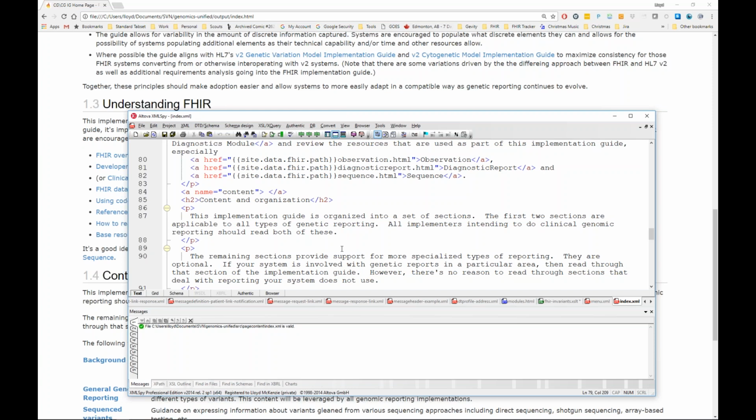It's also possible to have pages coded using Markdown. The CG.ig is not currently configured to do that because I don't like things that I can't validate, and I can't validate Markdown. But that is an option for workgroups that perhaps prefer to use Markdown markup instead of XHTML.